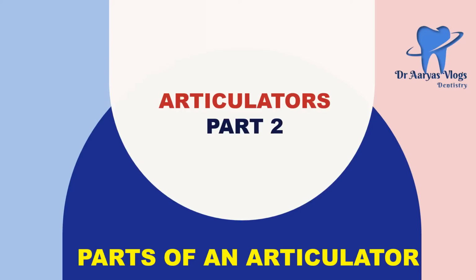Today we'll discuss the parts of a semi-adjustable and non-adjustable articulator in detail, and also the mounting procedures. It is very beneficial for BDS and MDS students, so don't skip this video.